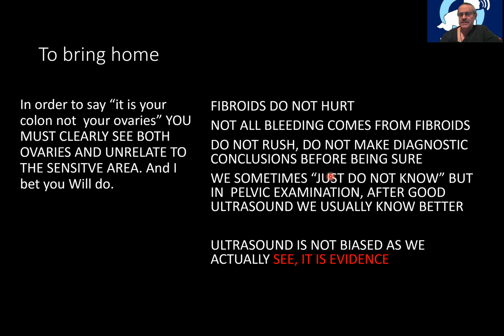Investigate the endometrium. It's not that hard. You should clearly see the endometrium. If you don't have vaginal probes, fill the bladder, full bladder, and then you will see the endometrium. Don't rush. Don't make diagnostic conclusions before being sure. Don't make conclusions before looking at the patient.